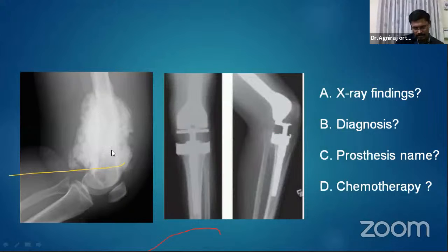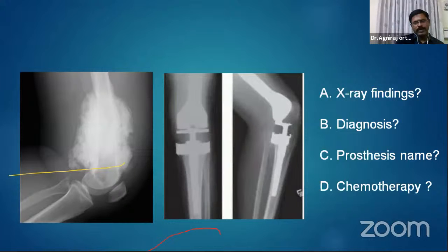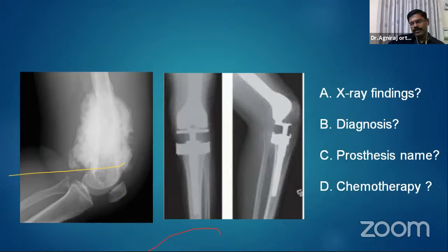Benign or malignant tumor? It is based on the findings. It's a malignant tumor. So do you want to give a diagnosis or a differential diagnosis? Sir, I want to give a differential diagnosis. Based on the location and the skeletal image pattern, it seems to be an osteosarcoma, sir, in the distal femur region. Very good. Osteosarcoma, the diagnosis everyone knows.